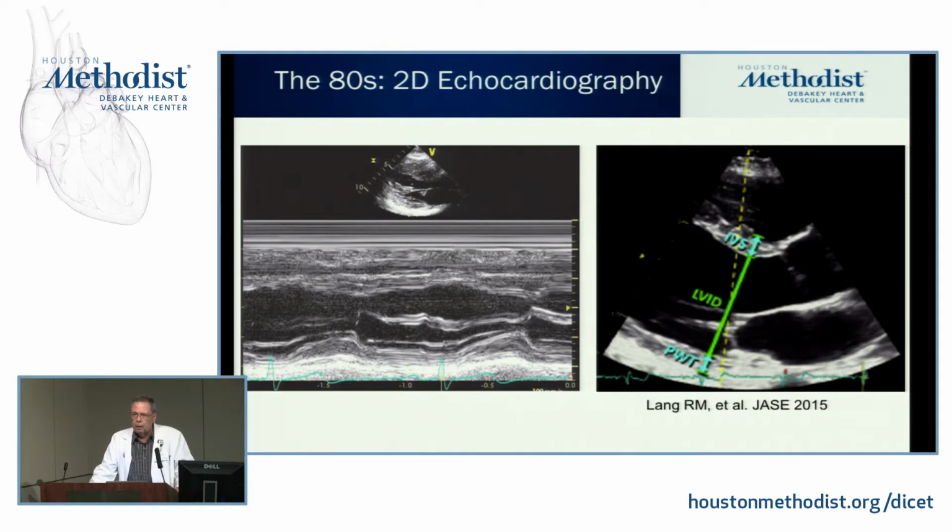And for that reason, current recommendations, unless you have the absolute magical, most excellent 2D echo in that day, do recommend that these measurements be made directly from the 2D. And basically, for all the fellows here, since it's a measurement that we do every day, what you want to do is establish a long axis of this heart. So this heart is a little bit tilted. The apex is somewhere here, and this will be your long axis. This diameter has to then be perpendicular to that imaginary long axis that you can draw. And then it's usually done just below the tips of the mitral valve.